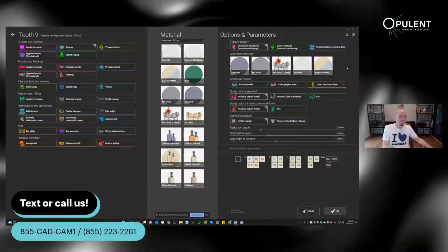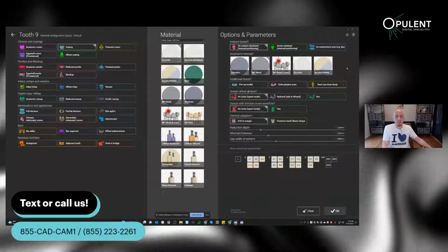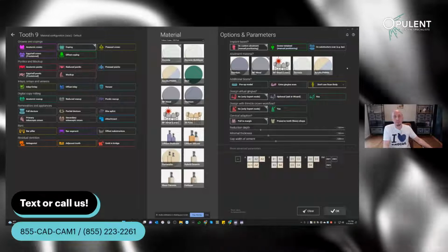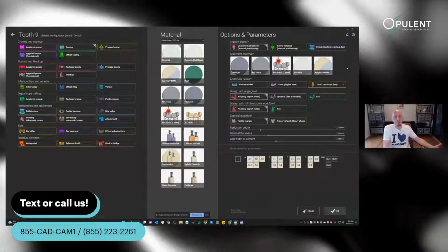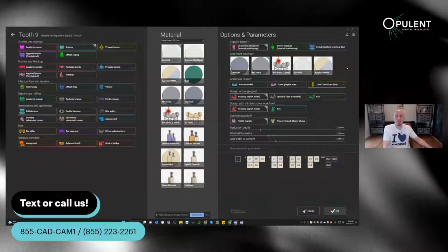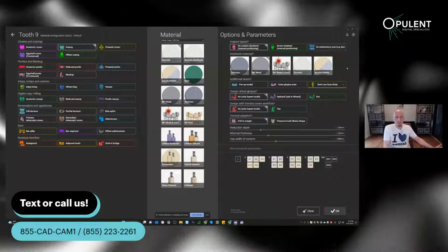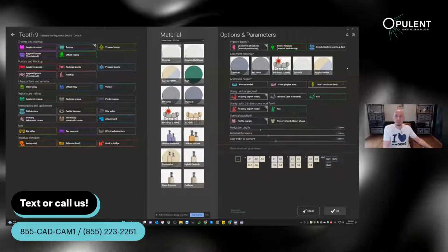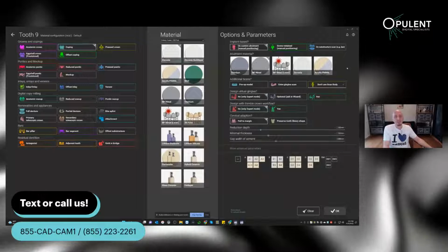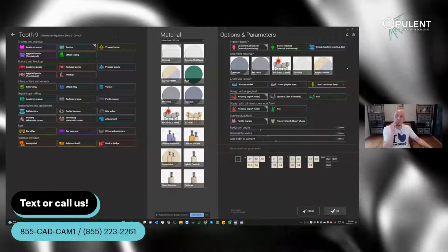And I want to talk a little bit about libraries today, and I thought this option especially is good to demo and show, because there are situations where things get a little iffy, they get a little screwed up. You have a case plan there, the case plan has a due date, the case has to leave, and if you haven't been there, you eventually will be at some point.